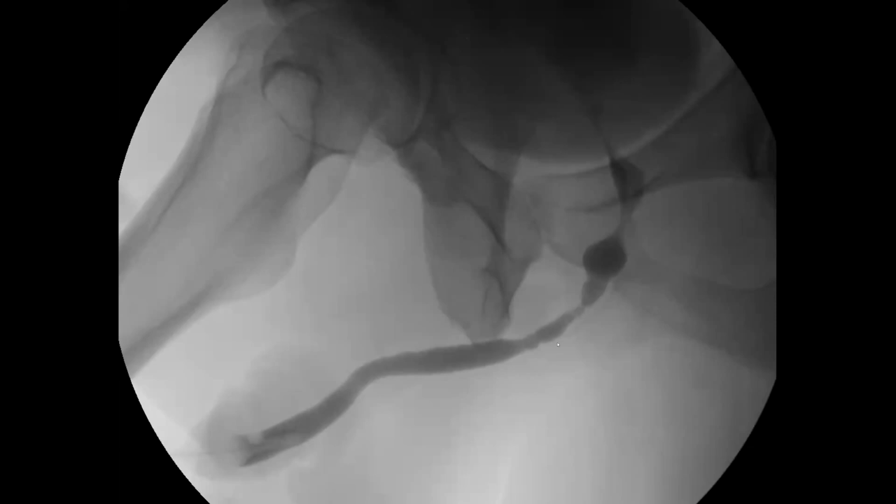with buccal mucosa. And then for extra credit, does anyone know what this little line is? Cowper's gland? Yeah, that's the duct for the Cowper's gland. So that's just reflux into a normal Cowper's gland duct. And the Cowper's gland is like a flower-shaped gland here that creates lubricant that lubricates this bulbar urethra. So don't mistake this for a leak. This is just normal reflux into the Cowper's gland.